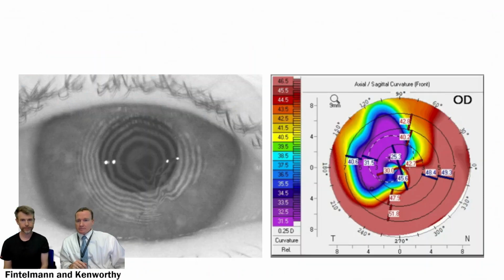Okay, interesting. This is just side by side, looking at the image of the irregularity of the cornea side by side with its topography. Again, in this axis is the AK that's gaping inferiorly, and also in this axis, the Pentacam will usually show central flattening and then a very sudden steepening as the table, if you will, drops off from flat to very steep.